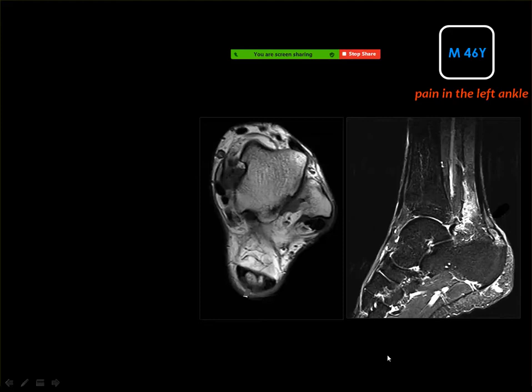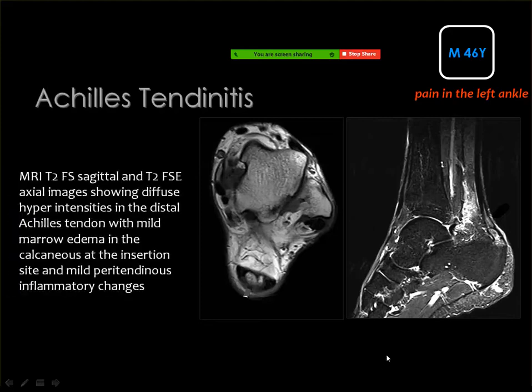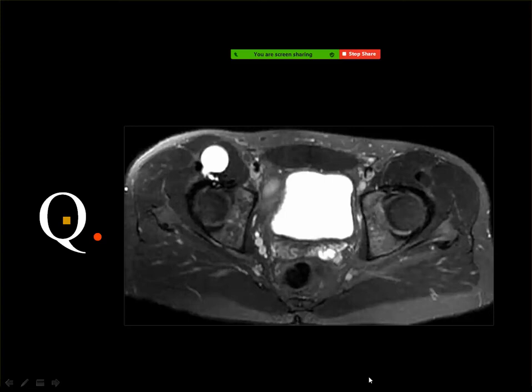This may represent that the tendon is partially torn, or you have Achilles tendonitis or tendon degenerative changes. For Haglund syndrome, you need some fluid anterior and posterior to the Achilles tendon. And this is an MRI of the pelvis, T2 weighted image.